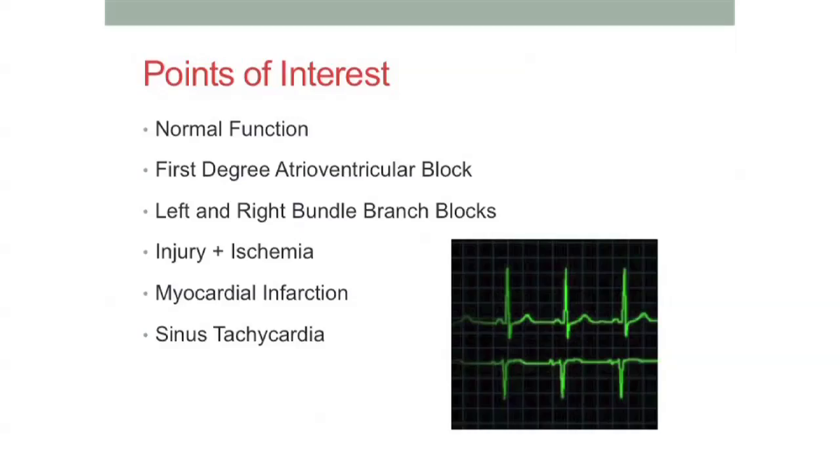Hi, we're exercise science students here at YSU, and we're going to be analyzing the heart's functionality and rhythm through EKG analysis. Some points of interest in this presentation are we're going to be looking over the normal function, first degree atrioventricular block, left and right bundle branch blocks, injury and ischemia, myocardial infarction, and sinus tachycardia.